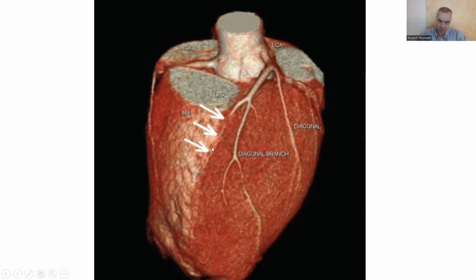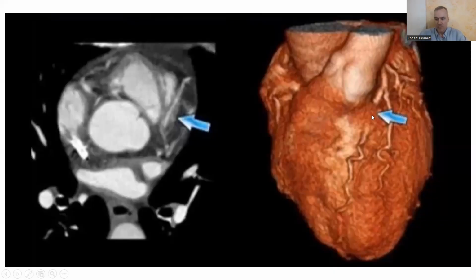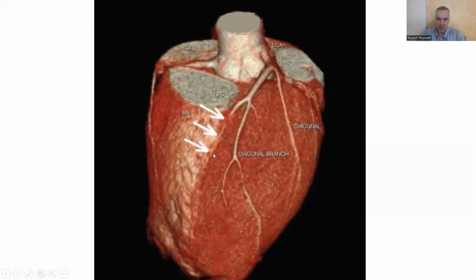We don't see the artery really pop out completely ever, and we should. We should see it very loud and clear, like these other ones, like the diagonal and the branches and stuff like that. But we do actually see traces of it, though. So we can trace it down like this. So maybe it's a little more superficial than say this one right here, but it also looks much longer than that one right there. So it's maybe more superficial, but also longer, something like that.